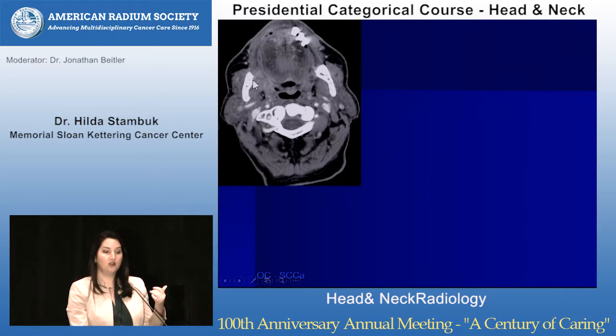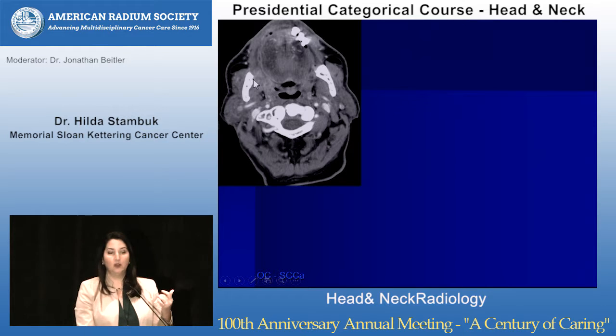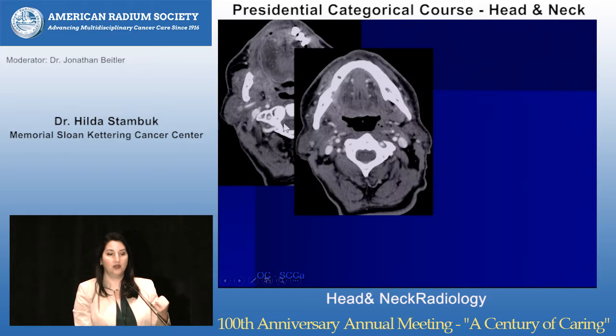Here's a patient with a retromolar trigone tumor. The tumor got on the pterygomandibular raphe. Since the superior constrictor muscle attaches to the pterygomandibular raphe, this tumor tracked along the superior constrictor into the tonsil. Don't confuse this with a tonsil primary. This is a surgical oral cavity case. So let's keep watching where this tumor went.